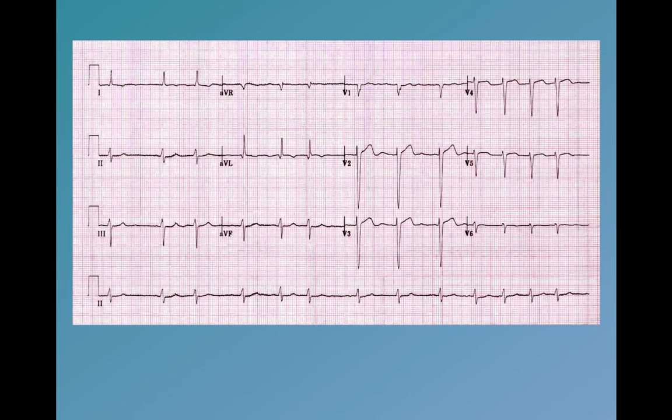And you can also pause this and look through all the other leads to see how's the R wave progression, is anything else going on. And actually, speaking of that, if you look at this, the R wave progression is pretty terrible from V1 to V6. I'm sure you could pick up a few other things on this as well.